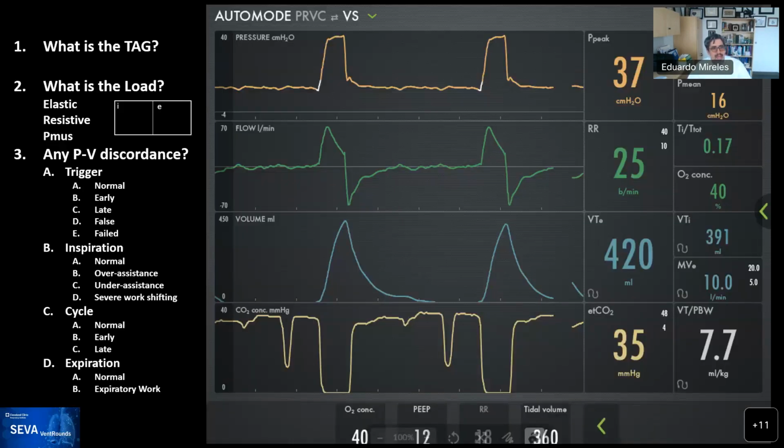All right, and with that, we move to this. This is the case in point, and what you have in this graph, you can see on the top, this is out of the ventilator. You have the mode itself, you have the pressure, flow, volume, and then the capnogram for this patient. And so you have time, and then you have the CO2 concentrations in millimeters of mercury.